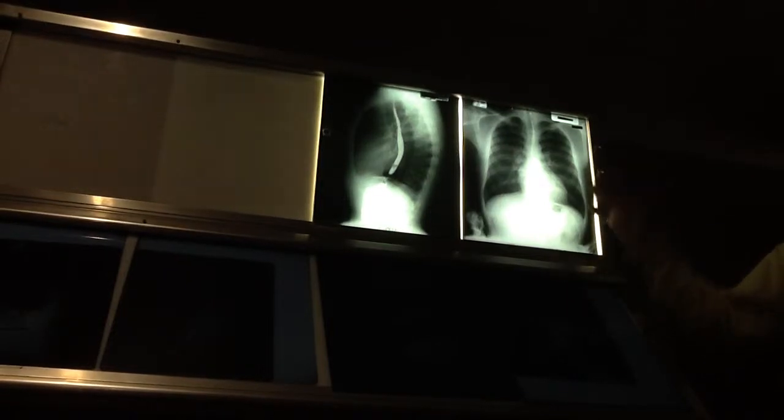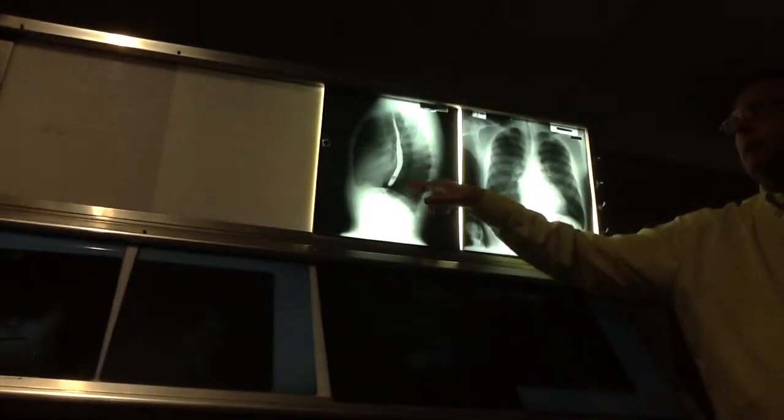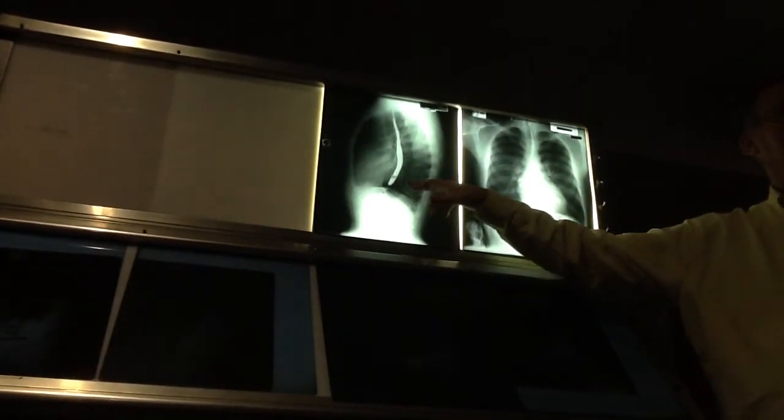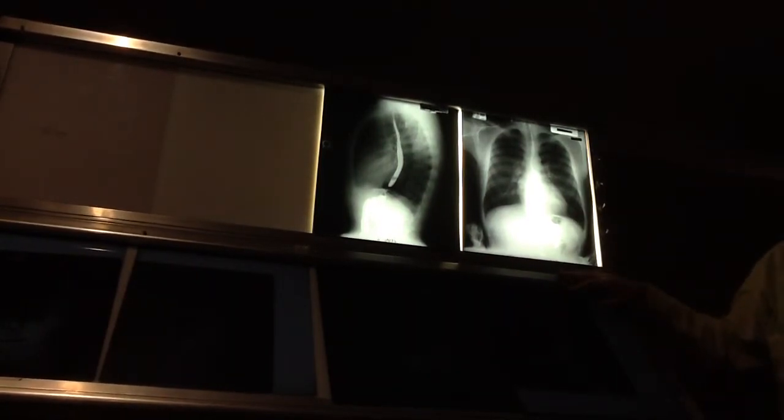Already, when we were talking about looking at some of the cardiac things, you can see how the heart is not extending beyond it. Okay, here it comes right up to the border and ends. Esophagograms also are still done.